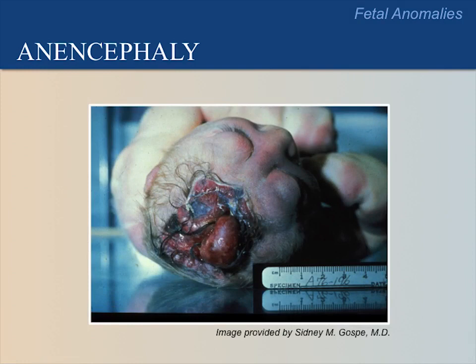This is an image of a fetus with anencephaly. You can see that there is no brain or skull above the level of the eyes. The skull does not cover part of the brain. The eyes appear quite prominent or stand out.